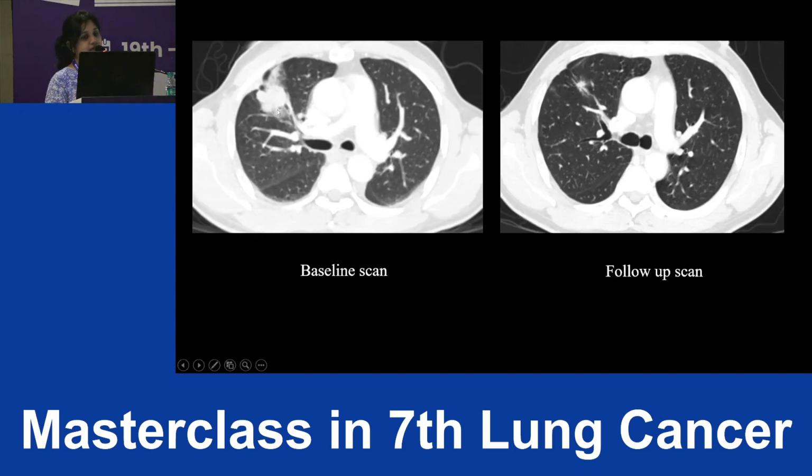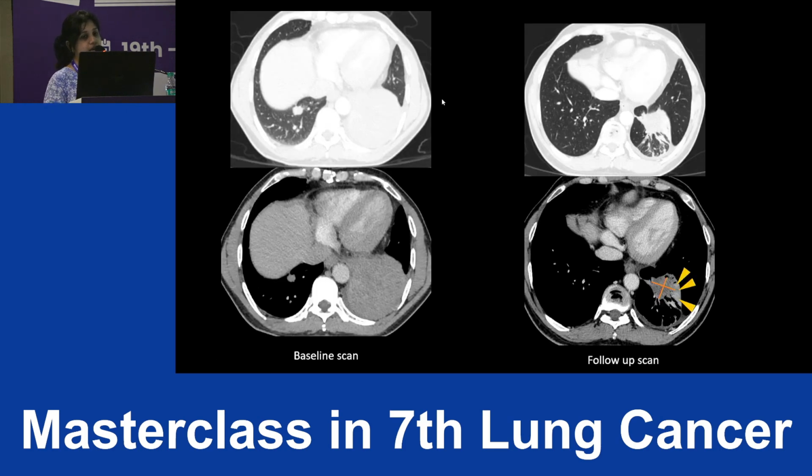Here you can see the baseline scans, there is more than a 30% decrease in the right upper lobe lesion, so this qualifies for partial response. In this scan also, there is a partial response. The left lower lobe lesion has significantly reduced, and the right lower lobe nodule has disappeared.